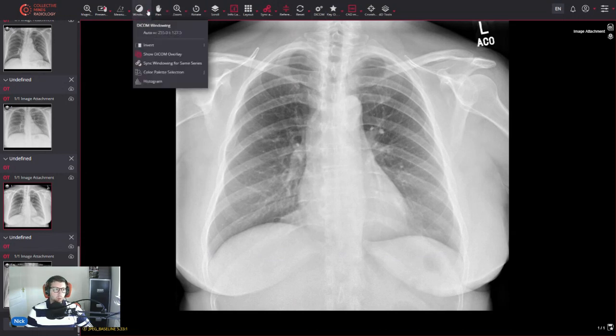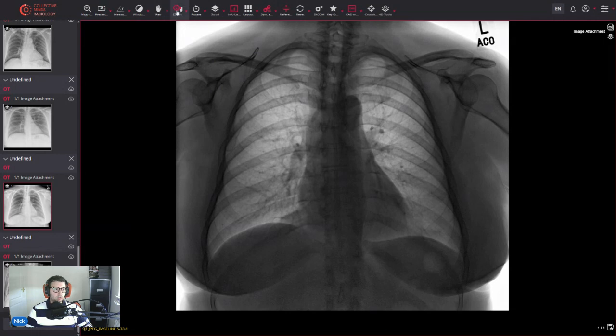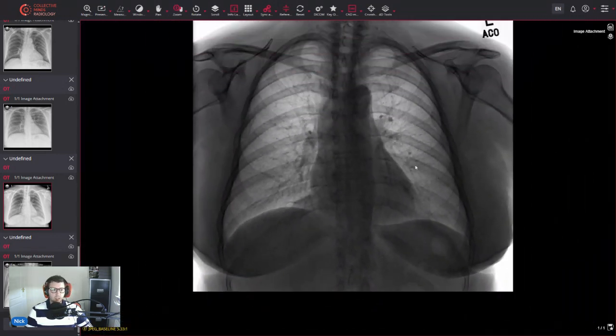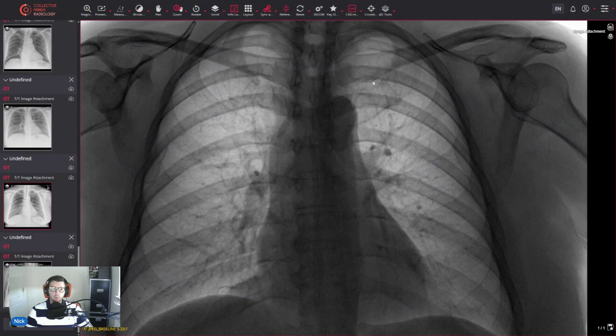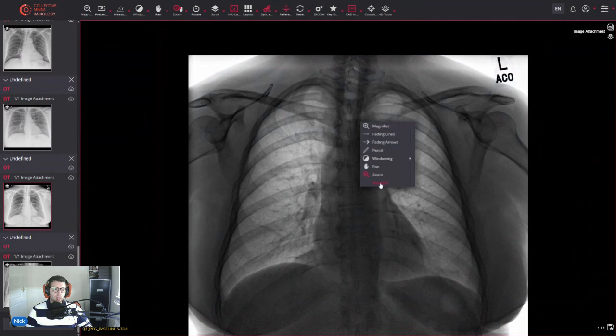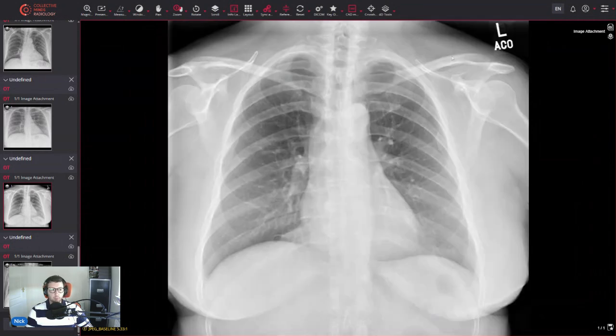And what you can do is you can invert the image, and sometimes it just makes it a little bit easier to see behind. Tumours are sneaky, they like to hide. Countless ones I've seen behind the anterior first rib. So really important just to double check those areas, guys, and make sure we're not missing anything.